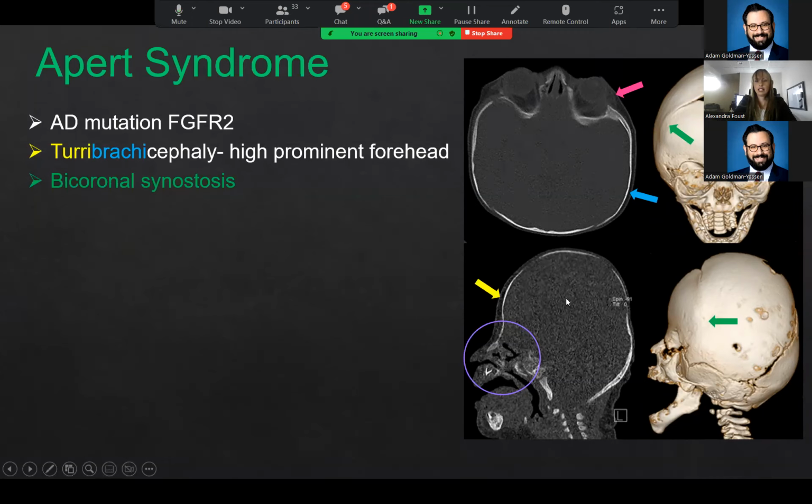You can still have sort of this more turicephalic appearance because you've still got growth along your lambdoid sutures and your squamosal sutures. They all tend to have this shape to the orbits, and the severity will vary a little bit, but they're kind of shallow, right? And maybe the angulation is a little bit more extreme than typical. The globes might seem to push out almost a little bit, which some will call exorbitism, and they may be wide set or hyperteloric.